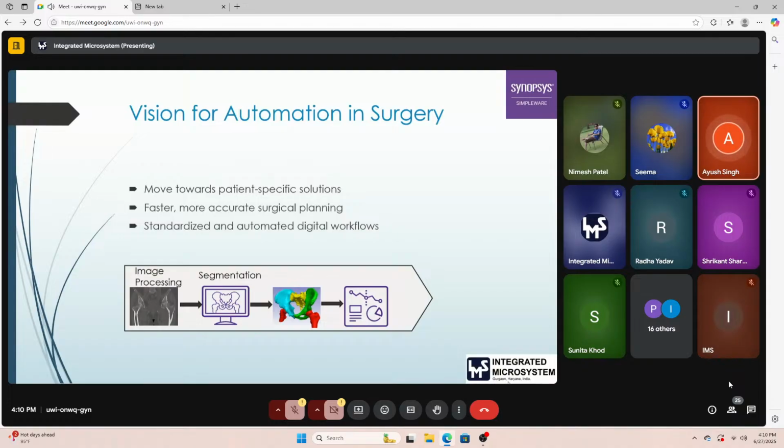And later on, enhancements can be done in the automatically generated segmentation output. Since we do not rely on conventional methods of working on each and every slice individually for the 3D reconstruction, which might take hours and hours just to do the segmentation, and more time when moving on to 3D printing or developing any FEA model or CFD model, it's generally advisable to do the automated segmentation and later do the remaining process using semi-automated segmentation. It will reduce our work time to around 15-20 minutes for any difficult anatomy that you are working on.